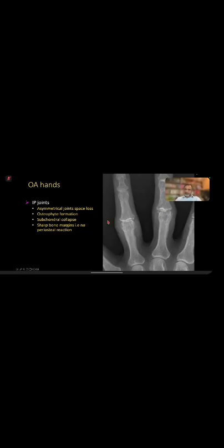And the most important negative point is that the bony margin is sharp. You can see the bone margin is extremely sharp, which is typical of osteoarthritis. So if I put these changes in any other joint, say the knee joint, the same thing happens. There's asymmetrical loss, osteophyte formation, there can be subchondral cyst formation, but the bone margin is sharp. Remember this, bone margin is sharp, because it's a disease of DIP or PIP joints. This will help us in differentiating from other conditions.